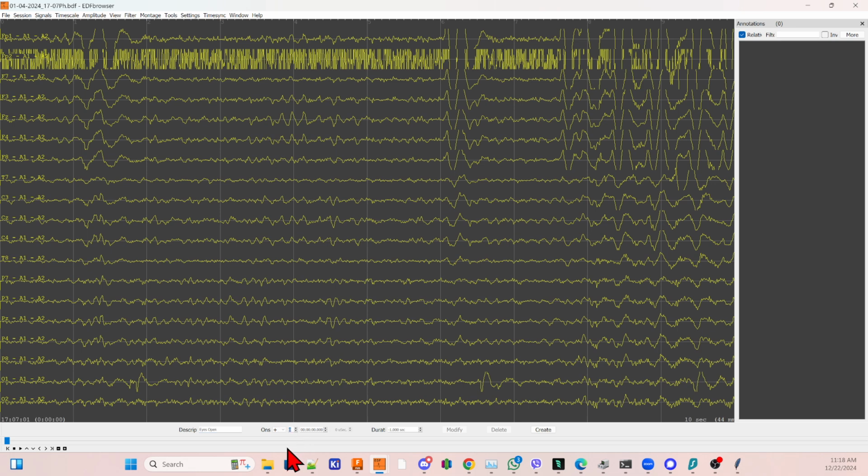Also, I don't use the mouse here to move around. Every time you hit tap, it moves. So it was 2 minutes, 02, 00, and then the milliseconds. I don't record stuff in milliseconds. And this was going to be a 10-minute period, so the duration is 600 seconds and create. And now you can see it appears right over here.